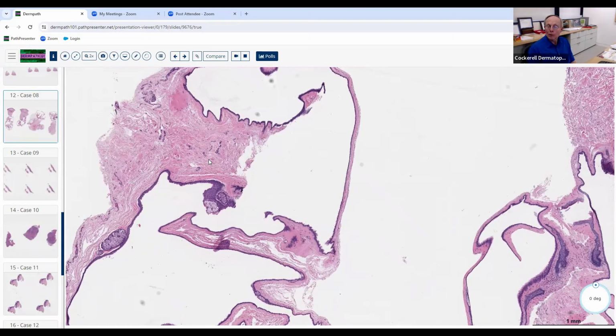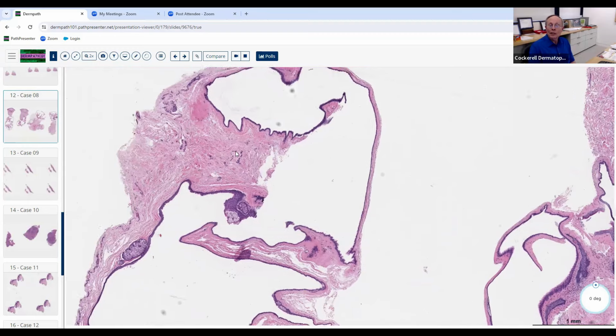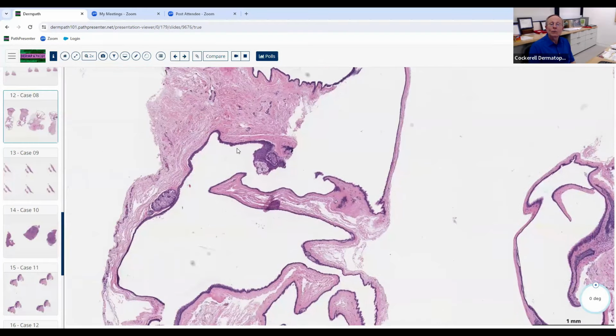So if it's apocrine epithelium or eccrine epithelium, it's a hidrocystoma, apocrine hidrocystoma and eccrine hidrocystoma. If it's follicular epithelium, it's either like an infundibular cyst or an isthmus-catagen cyst, if it's occurring in the area where the isthmus and the catagen follicles, when they go into catagen, develop that characteristic sort of glassy basement membrane zone and get a trichilemmal type morphology there. Some people call those trichilemmal cysts. Is it an infundibular matrical cyst or pilomatricoma? That's another name for that.